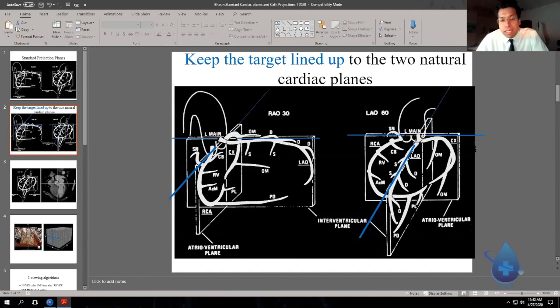Some of you already have an algorithm in your brain. If you've been training some in cardiac CT, great. I don't want to disrupt that. If you already have an algorithm, perfect. But just go through the steps and incorporate the parts of my algorithm that maybe you don't have in your algorithm and blend it together. That's why I gave you all of these sheets as PDFs and as Word files, to make that amalgamation easier for you.